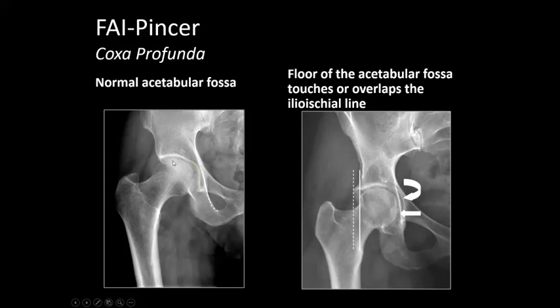And because it's normal, about a third or a quarter of the femoral head remains exposed, i.e. not covered by the acetabulum. So that's a normal appearance of the hip. Always make sure there's about a quarter of the femoral head that lies lateral to the acetabulum without acetabular coverage.